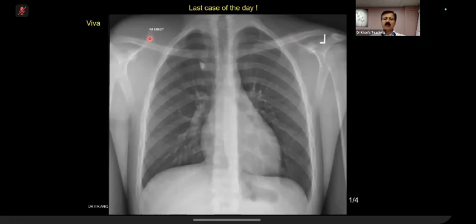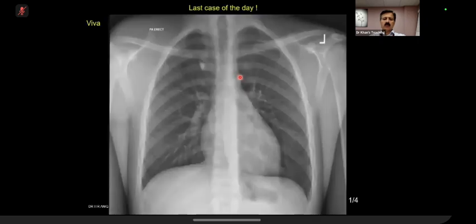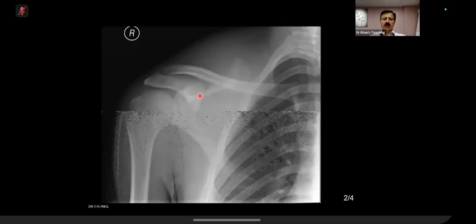So there is something happening, a bit of permeation, expansion, or destruction, whatever. So once you pick it up, I'm showing you a close-up, there's a bit of a technical problem in here, but just to make the point that this is that soft tissue and here was that bony destruction. This is too easy, of course, but here it becomes a bit difficult.